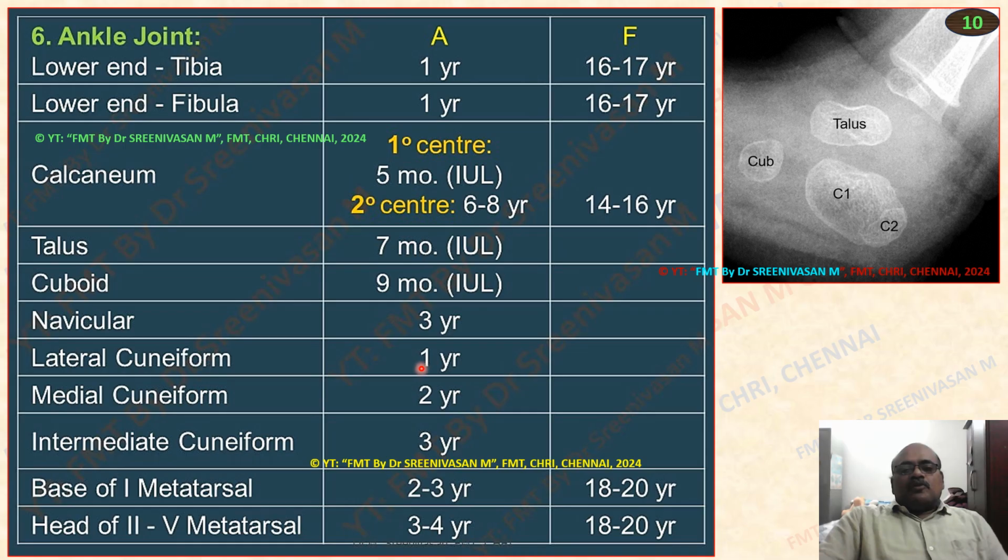Then lateral cuneiform 1 year. L for lateral, we can remember as 1 year, similar to lateral epicondyle, where there are 2 L's. So for lateral we can remember 1 year, right? Then medial cuneiform 2 years: lateral 1 year followed by medial cuneiform 2 years.